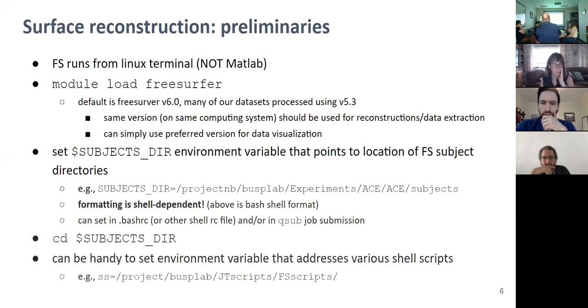You want to write scripts essentially to run the commands. So what you can do is you could always copy every script right to the subject directory all the time, or you could do something like have a scripts directory.